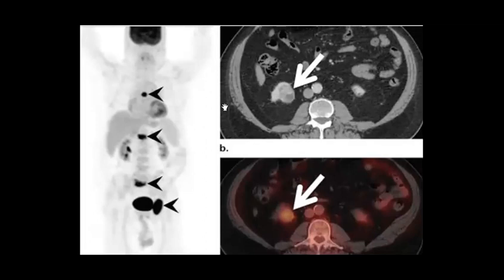Yes, and where is the metastasis here? Perfect. So it will be RCC, renal cell carcinoma. Even in the FDG, it doesn't have severe or high uptake, as you see. It's like mild to moderate. So sometimes the RCC doesn't show uptake, or sometimes shows low grade uptake. Yes. And here, that's why you can say that this one is stage 4, because it reached the bone.